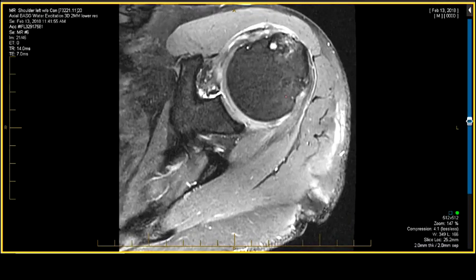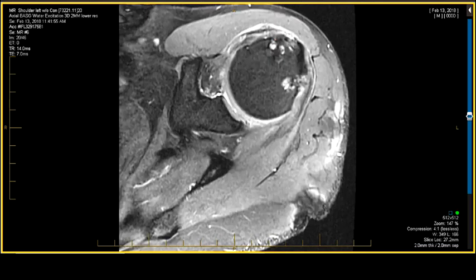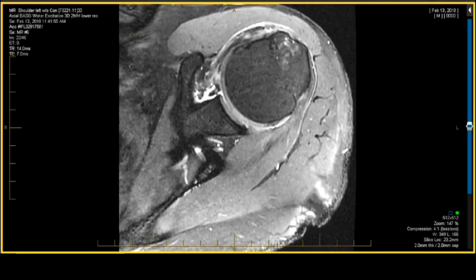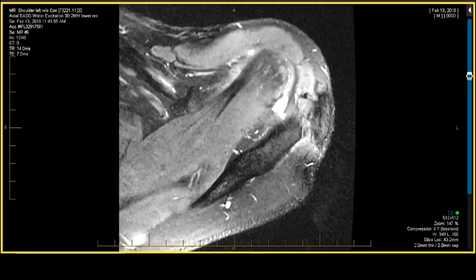There's an effusion, there's bursal fluid, and there's signs of internal and external impingement as determined by the presence of impaction-related or friction-related pseudocysts posteriorly for internal impingement and anteriorly for external impingement, and we haven't looked at anything but the axial. Got a lot of information, didn't we? We've also deemed that the rotator cuff might be injured, but it's intact. The major fibers are still there of the supraspinatus and infraspinatus cuff. We could probably read the whole case off the axial if we wanted to.